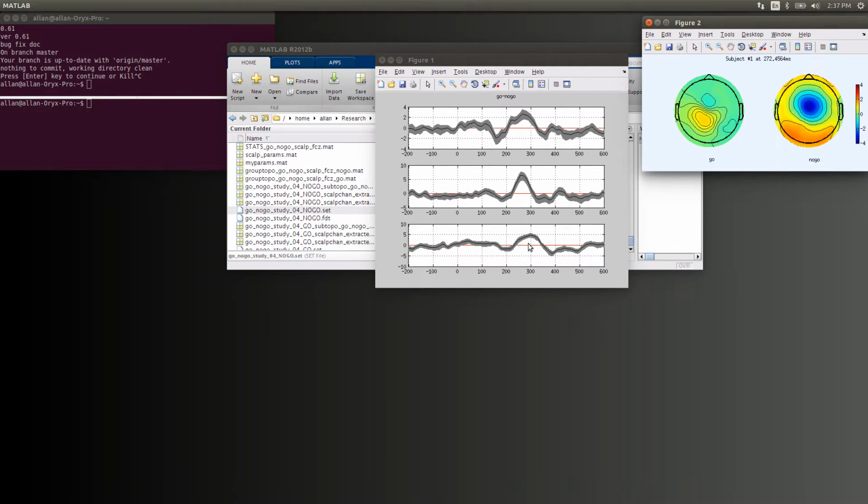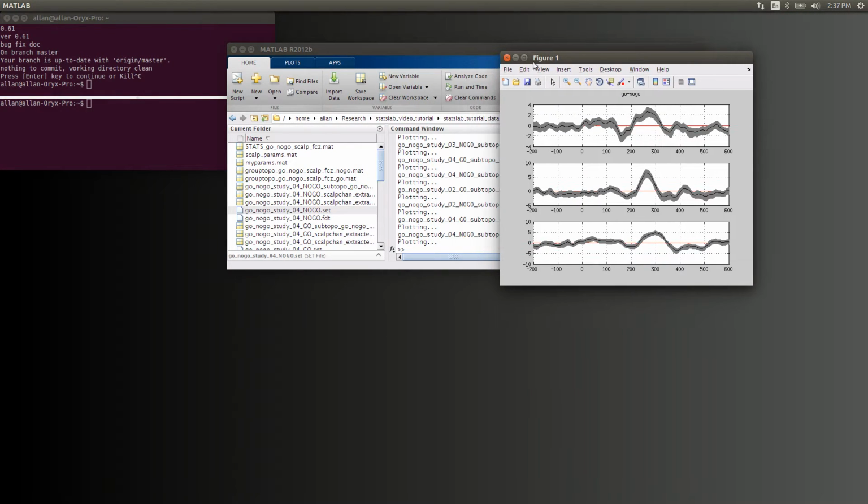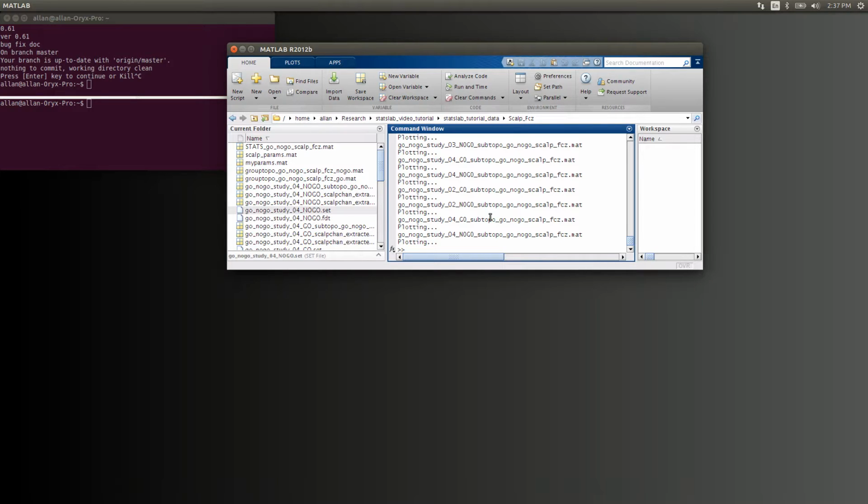Subject 1, subject 3, so on and so forth. Okay. So that's one full analysis just using a scalp channel. Okay.